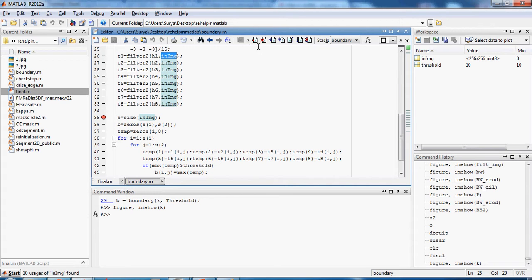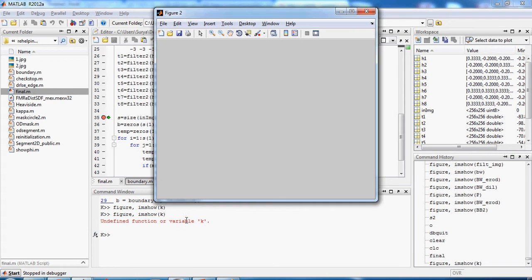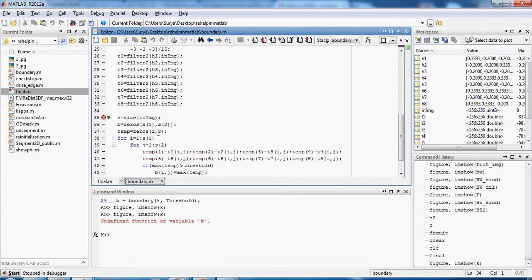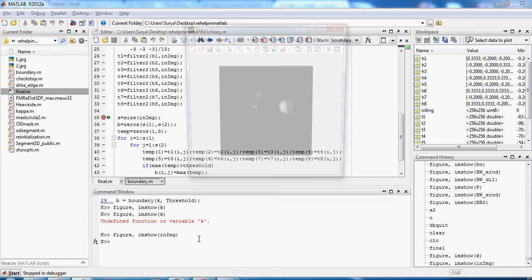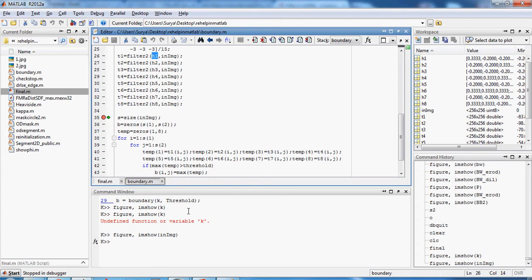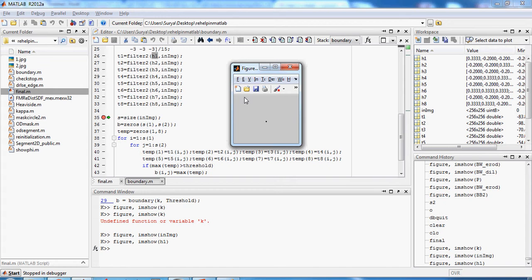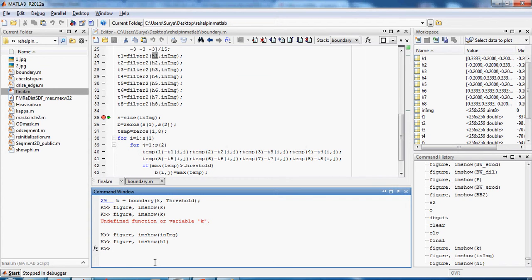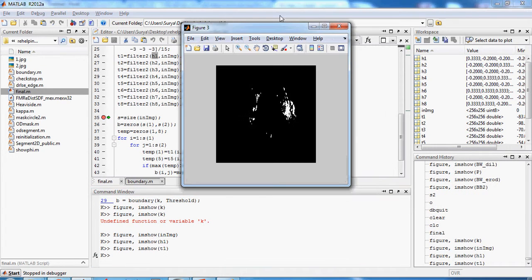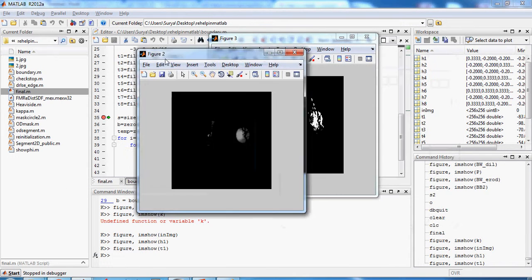Let's see what happens here. Okay, we are here now. Let me just show you what happened. The input image is in image. So this is your image, and then when you apply h1, which is the horizontal filter, let me give you a little more intuition on what happens. I'm sorry, I was supposed to display the output when you apply the filter h1. Now let me show you both the images.